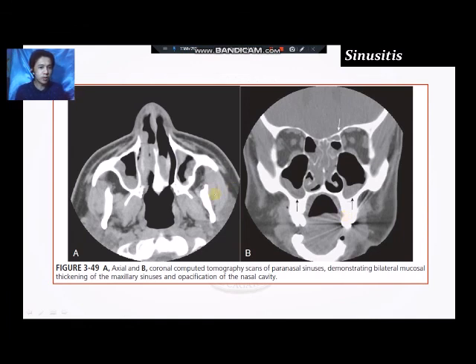Okay, mas klaro pod sad ang fluid accumulation if ever naka-CT scan si patient. So this is the maxillary sinus of our patient. Mo kaning puti, this is the bukog ni patient. While this one, kaning grayish nga portion, na siya, those are the inflamed niya nga mucus, no? So, nana sila mga fluid accumulations yan. Also in this one, demonstrated also. So, these are the fluid accumulations within the sinuses of the patient.